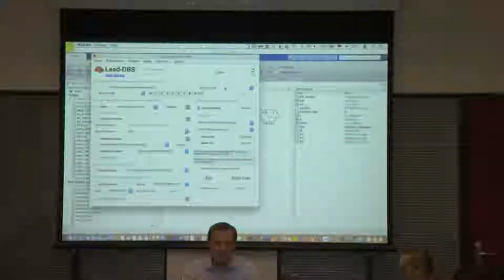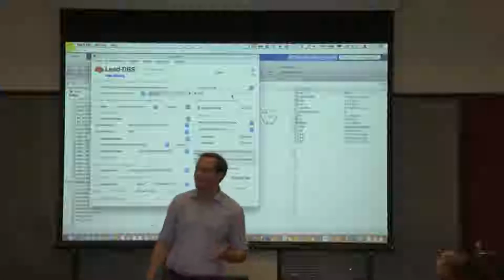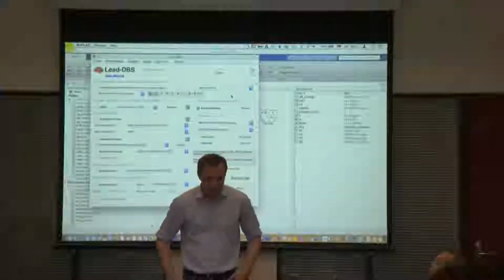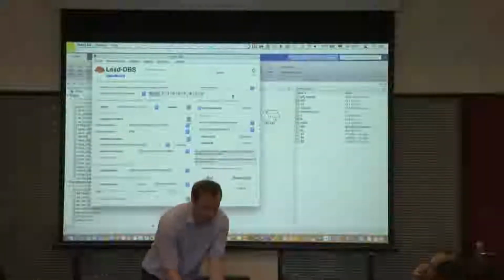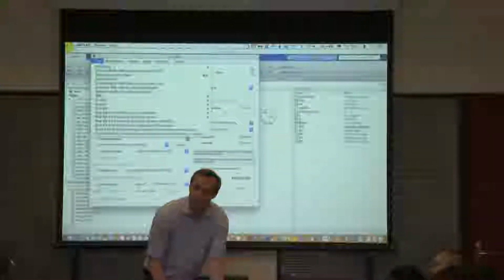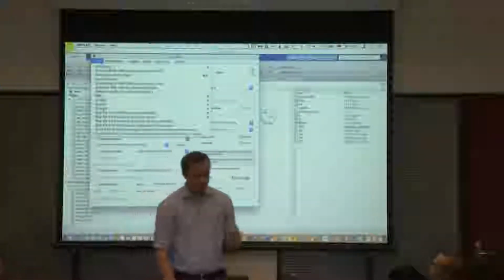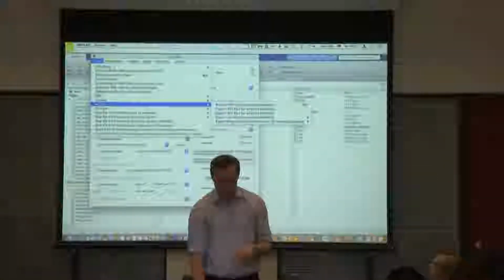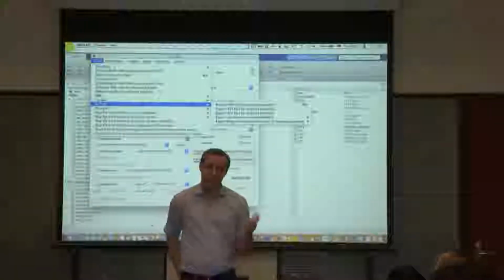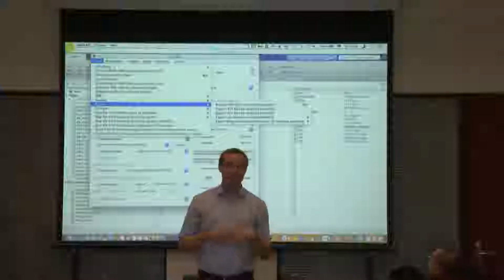I remembered what I wanted to show you before. Based on Andreas' great talk, there are some more things we can see in the tools menu that might be important or interesting. Essentially, you can use Lead-DBS also to export PDF files, similar to what the pipeline does, also with a 3D viewer. But it needs some configuration, and you need LaTeX and so on.